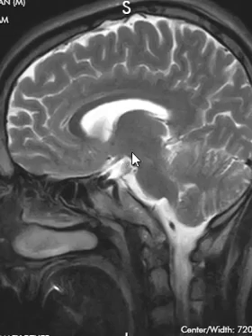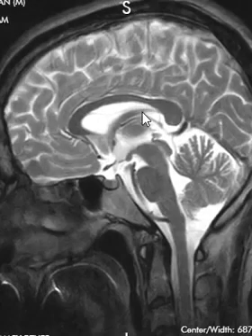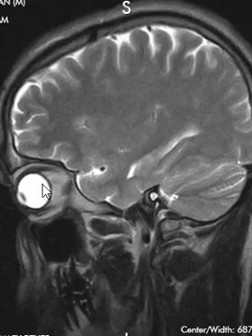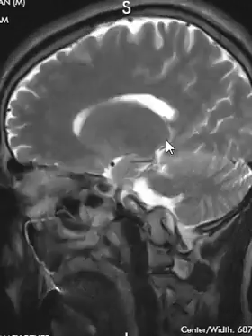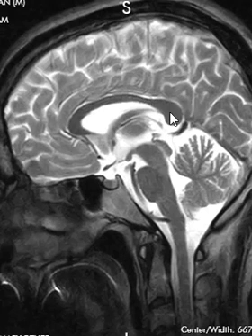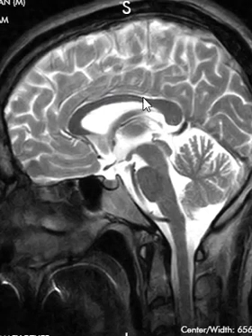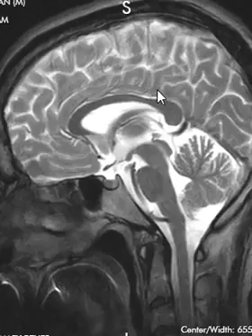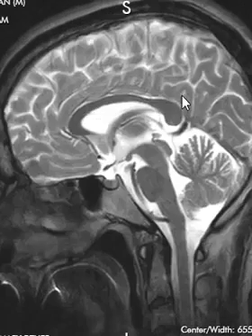And so again, this is all the cerebrum, and the cerebrum has a right side, a right cerebral hemisphere over here. Here's the right eye, and then it has a left side, and the right and left sides are joined by this broad band. It's like a wiring harness right here. It's called the corpus callosum. So we look carefully at the corpus callosum. Sometimes there can be developmental abnormalities in that, or sometimes people with multiple sclerosis will have little lesions that go right up to the edge of that. So we look at that. It looks good in this patient.